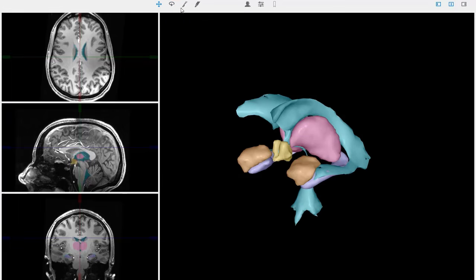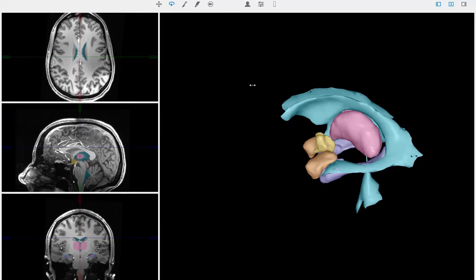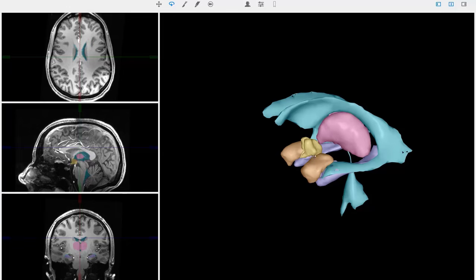Now, if you look at the anatomical relationships, I'm going to give you an important clue here. If you're slicing through the brain coronally and you slice through the hypothalamus, which is a midline structure sandwiching the ventricles here in yellow, laterally in the temporal lobe, you should be slicing through the amygdala. If you are more caudal, cutting coronally through the thalamus, then you should look into the temporal lobe and find the hippocampus, right? So amygdala and hypothalamus are in line with one another. Thalamus and hippocampus are in line with one another.